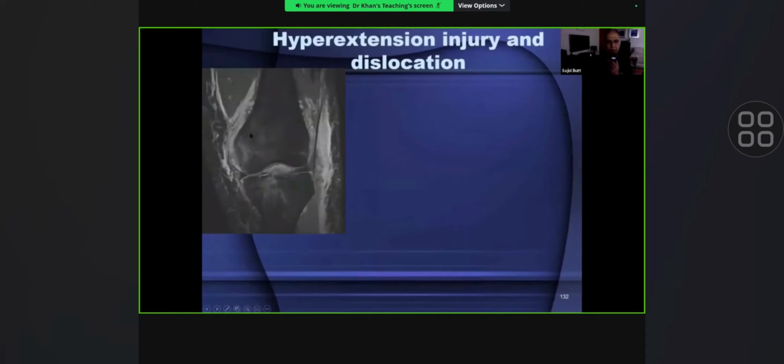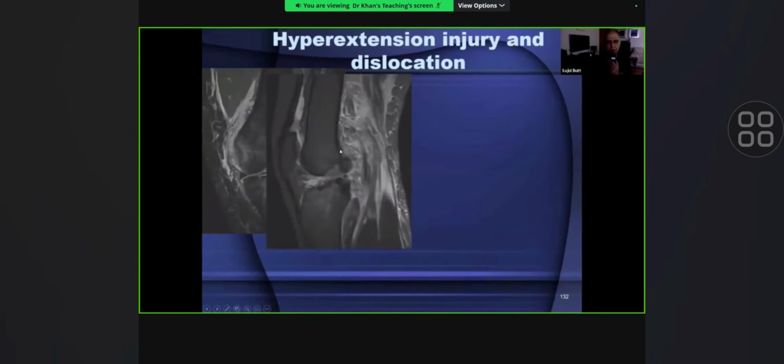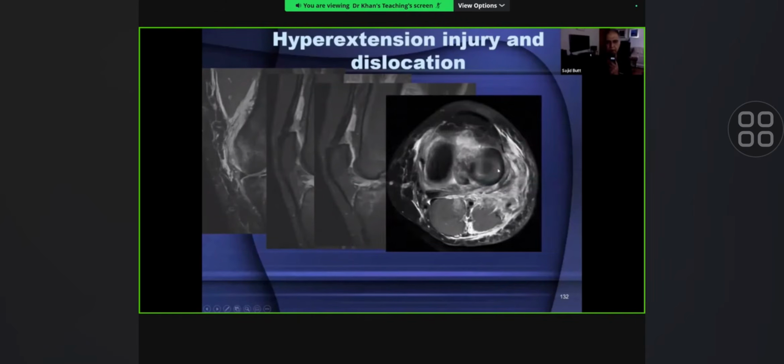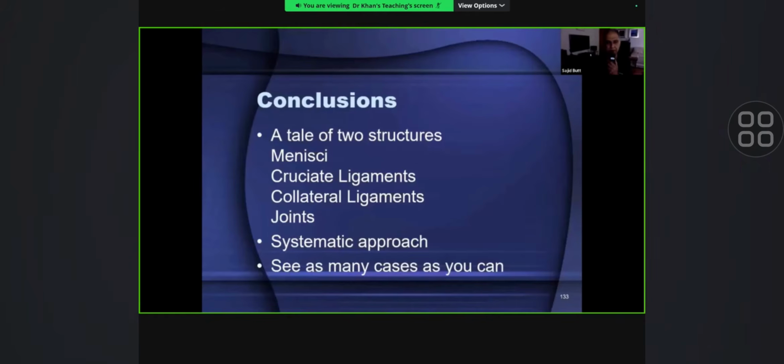In knee joint dislocation, you will have bizarre patterns of bone bruising and soft tissue injury affecting both lateral and medial sides. Very extensive injury to the posterior aspect of the knee joint soft tissues. Imagine what is happening to all the neurovascular bundle present here, with disruption of the ligaments, bone bruising, and significant soft tissue trauma. This injury, although I've said that it's not common, does happen. And I've seen examples of it not uncommonly, showing multiple ligamentous traumas and surrounding soft tissue injuries.